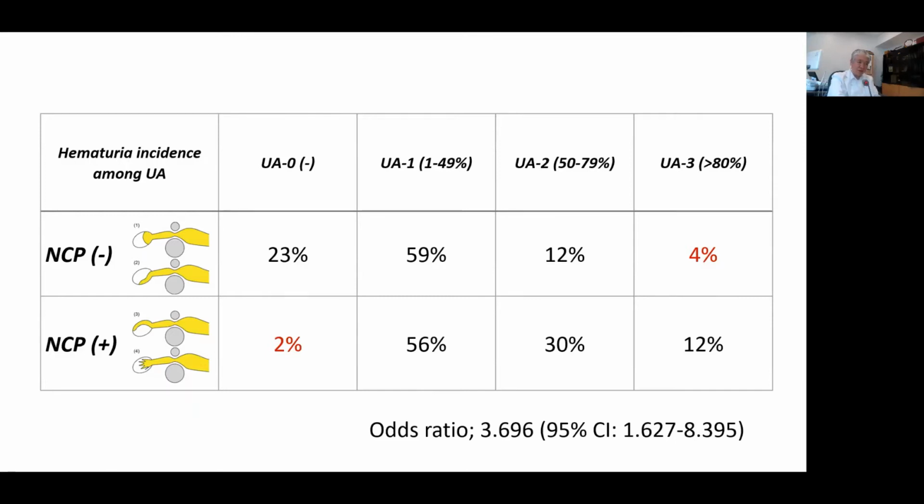Therefore, as we expected, when we are evaluating follow-up CT images of post-operative bladder cancer patients, we need to evaluate the flow patterns of contrast opacified left renal vein flow at early phase CT. And if a patient with microscopic hematuria shows CT findings of Nutcracker, then we do not need to worry too much about tumor recurrence, because the hematuria in this patient is probably due to Nutcracker phenomenon.